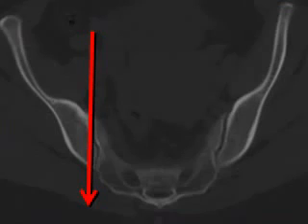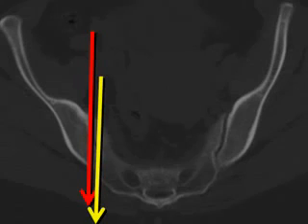When the frontal X-ray beam passes through the anterior aspect of the sacroiliac joint, it catches a portion of it in tangent. Then, when it passes through the posterior aspect of the sacroiliac joint, it usually catches the more medial aspect in tangent. This produces the appearance of two sacroiliac joints on each side. In reality, of course, there is only one.